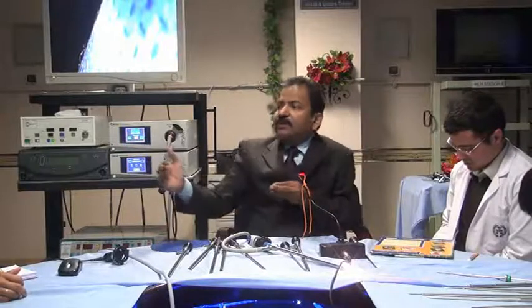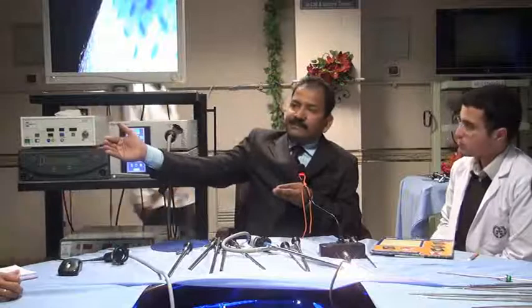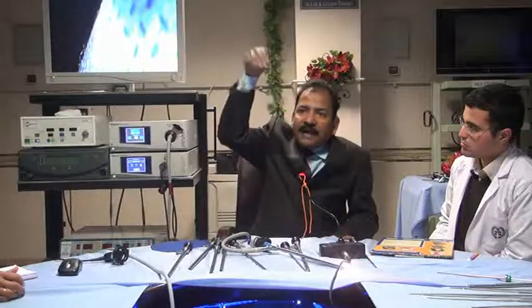But if the fibers are all around the prism, then the shadow won't be visible. Like if I throw the light straight on his face, then the shadow will be just behind his face, which my telescope cannot see. You see it? If you want to see the shadow, then the light should come from some angle.